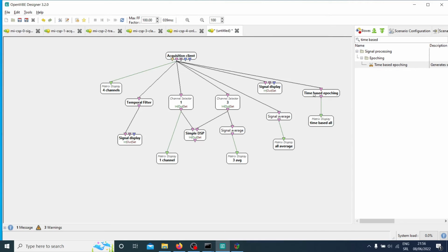Okay, so what happened here is that it's trying to display 256 values at once, and even for 4 channels. So it's a lot, and thank God it didn't just explode. My computer is still working.